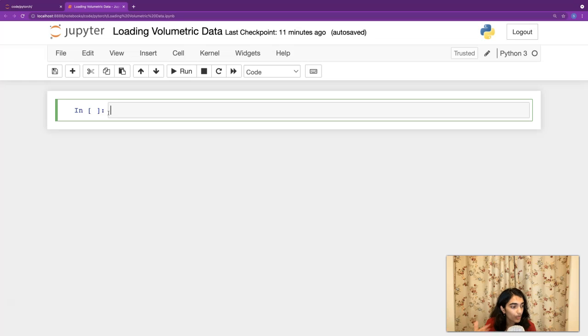Okay, since it only has 1 intensity channel, the shade of gray, darker or lighter, represents the density, but if you were being even more specific, it also entails the atomic number of whatever substance we're dealing with.